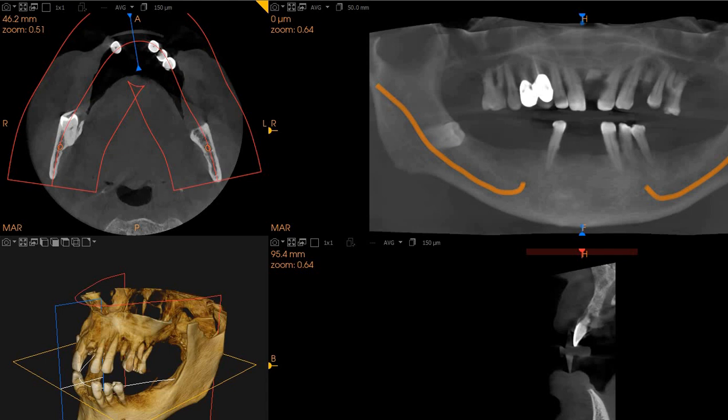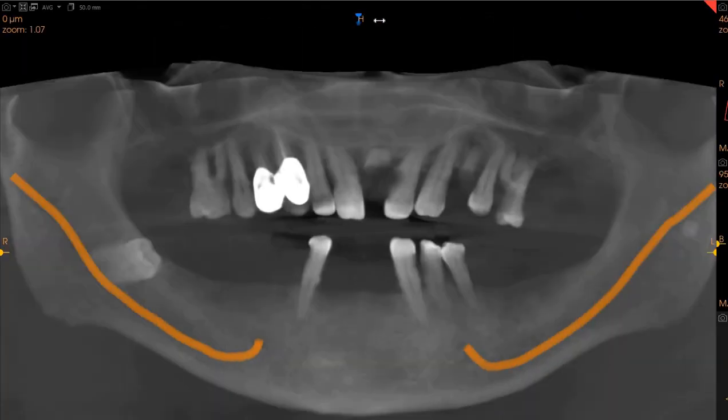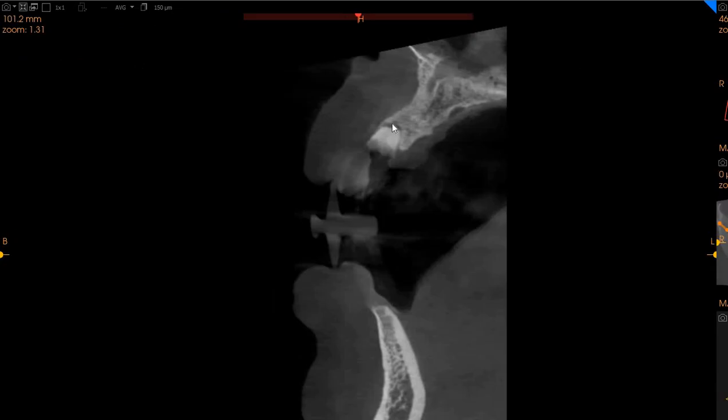This is the CBCT of the patient which you had requested. The area of interest is the upper central incisor. Now, this is going to be a long and complicated video, so just sit back. There are going to be some details that you might not understand.